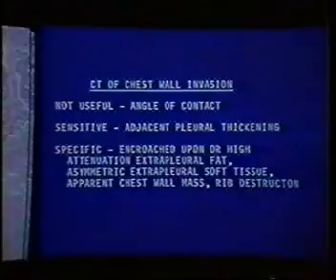Now, one thing we found to be quite sensitive is the presence of adjacent pleural thickening. That is, if there was going to be chest wall invasion, just about everybody would have some adjacent pleural thickening. Unfortunately, this sign is not specific. There are a lot of other patients who have adjacent pleural thickening who do not have chest wall invasion. Here's one such patient with lots of adjacent pleural thickening adjacent to this large peripheral lesion. Turns out to have no chest wall invasion. Another patient with adjacent pleural thickening who does have chest wall invasion. So it's sensitive but not specific.